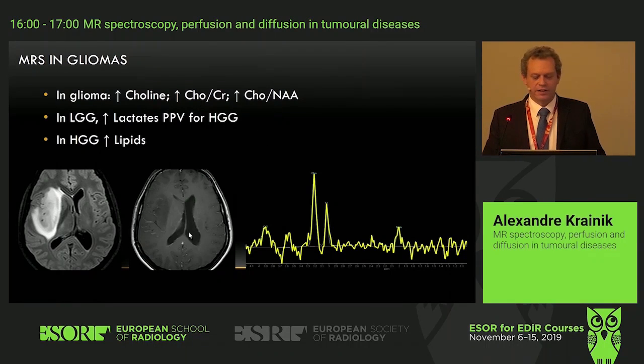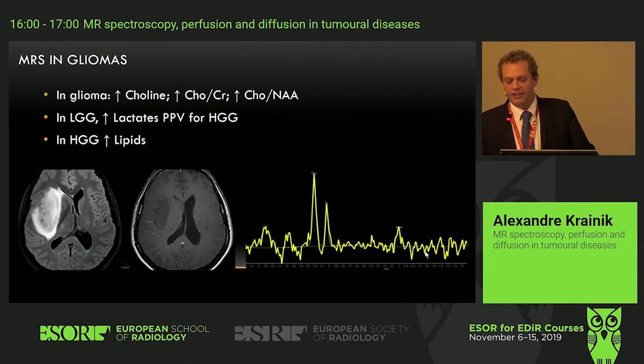Here it's an abnormal peak of choline. You see the choline is higher than creatine and NAA, but there's no peak of lactate, nothing in lipids neither.